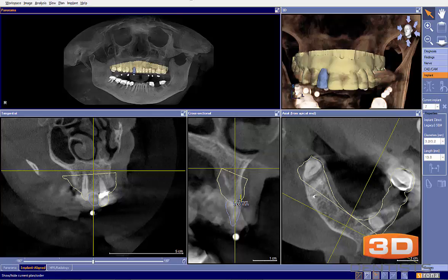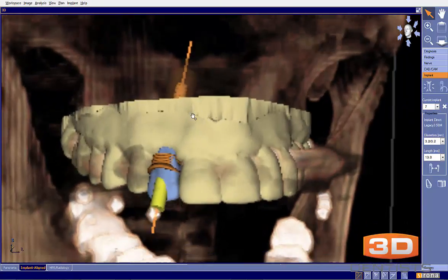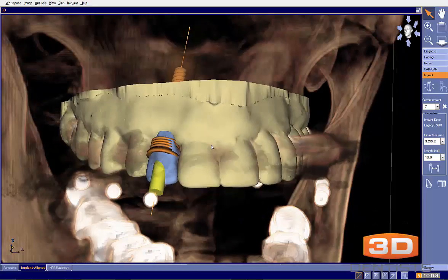So now let's take a look at the implant plan as it was provided to us. Generally speaking, a pretty nice plan. What I'd like to do is begin with our CEREC design itself, and the first thing I would take a look at here is gingival margin levels.